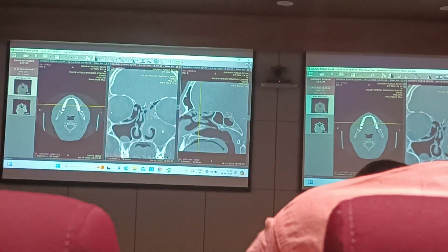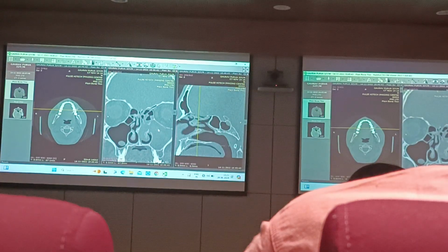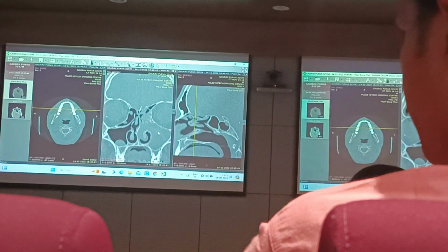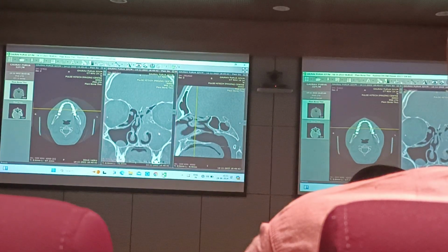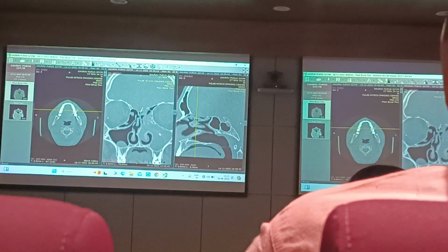So what does this tell you roughly? Fungal growth. Yeah, it's probably fungus here. Few concretions here and there. You can start seeing. Okay, this was a case of fungus, but I always make it a point to say: unilateral frontal, unilateral sphenoid, unilateral maxilla, don't touch it till you do an MRI. Simple. In case of difficulty in diagnosis, always do it.